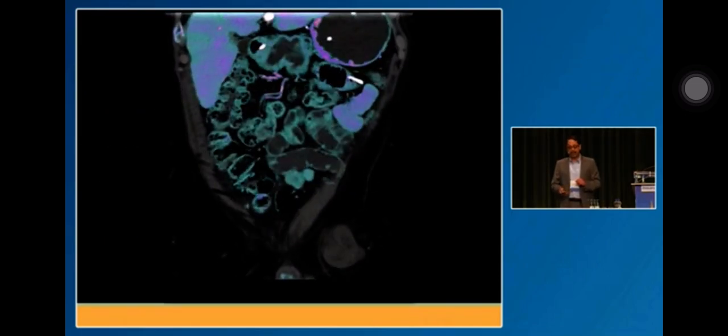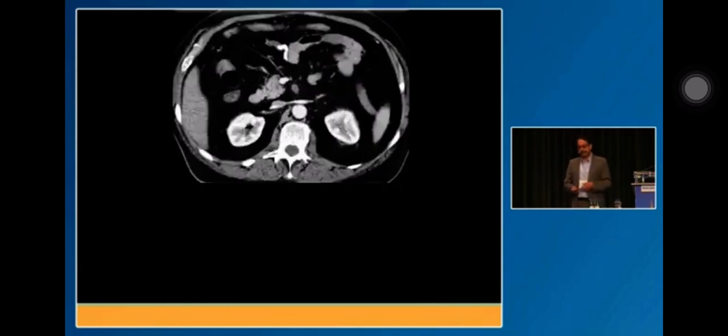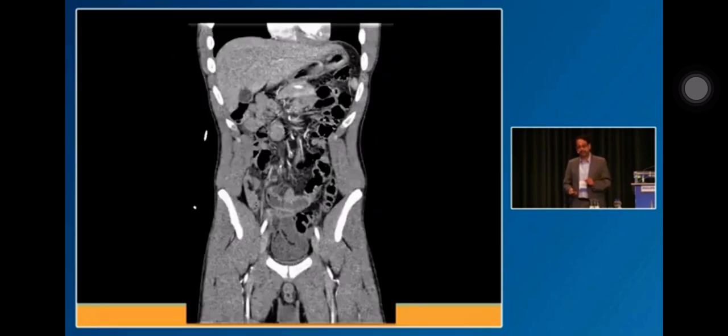This is a femoral hernia that's ischemic. Again, very, very straightforward with spectral CT. Even when you have pretty obvious abnormality, like in this case, the SMA is occluded, spectral CT can tell you the extent of ischemia really well. So these right lower quadrant bowel loops, they look completely normal on conventional images. But on spectral CT, there is no iodine uptake in these loops. 80 centimeters of bowel was resected in the OR.